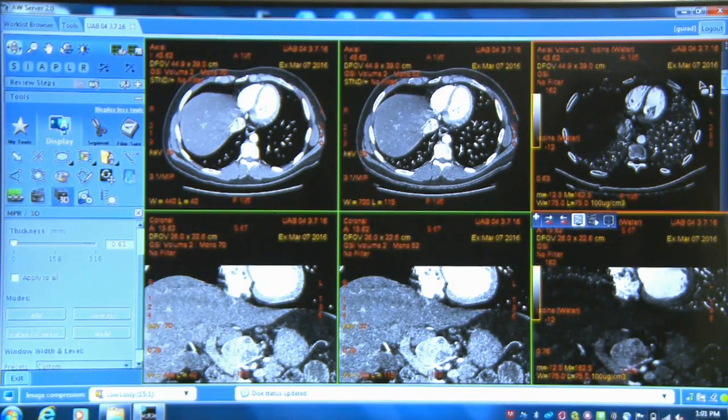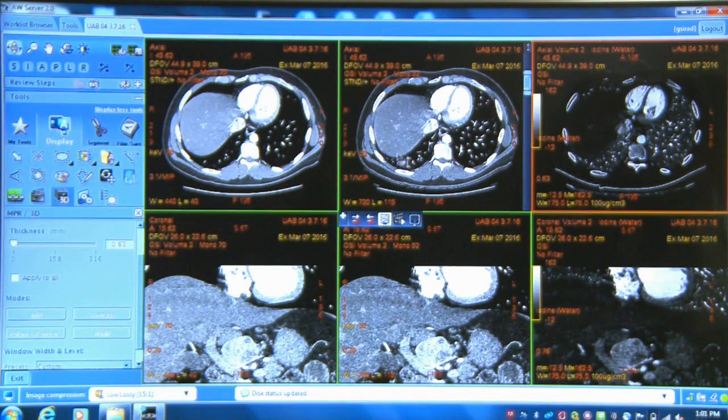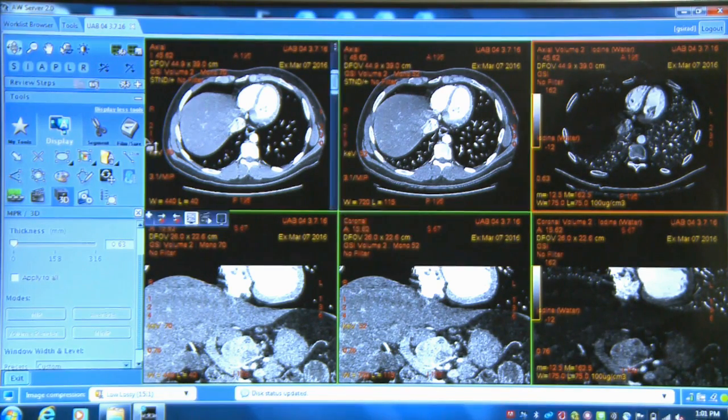As I was referring to in the presentation, you want to know exactly how many and where the metastases are so that they can be resected. And as it turns out in this patient, just peeking behind the word water there on the iodine image, also visible on the 52 keV and 70 keV image, there's the 5th metastasis.